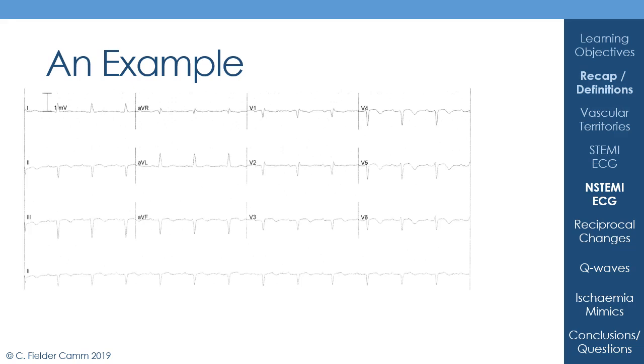Okay, so hopefully you've had a chance to interpret the ECG, and we'll start going through. We don't have any details about this patient because the ECG has been anonymized. From a technical point of view, this is technically acceptable. You can see at the top left-hand corner there's a little bar that looks like a capital I, and that bar height is used to work out how sensitive the ECG is by putting in 1 millivolt, which is what it says right next to that bar, 1 mV, and its width is the paper speed, and that appears to be normal.